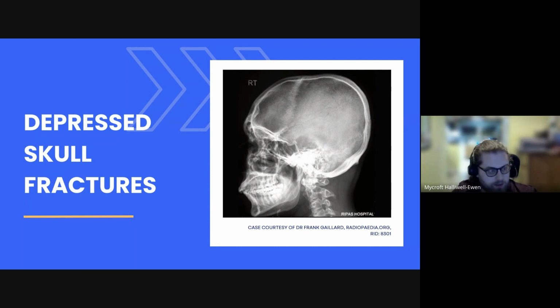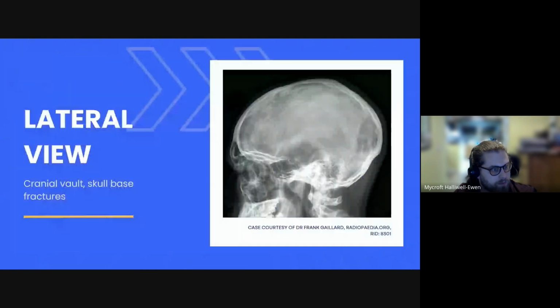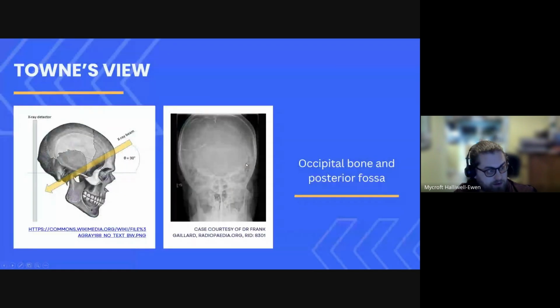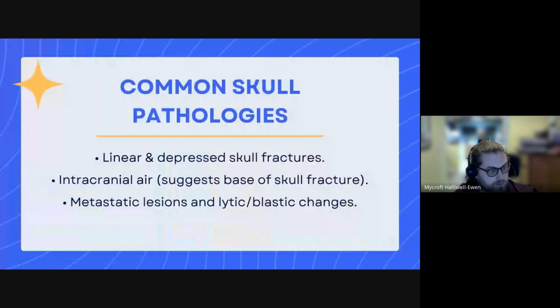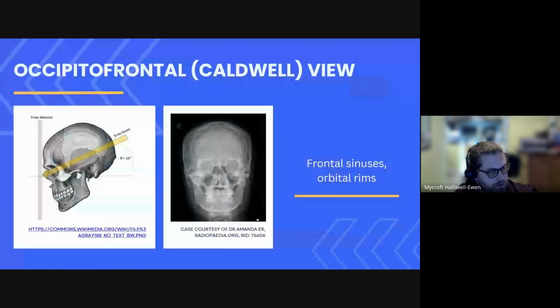I'll see if we can see it. It might be less pronounced. See if we go back to the lateral view. Can I convince you there is sort of a dip here if this person straightened their head up more in that direction? People do have different shaped skulls. That is entirely known and normal.